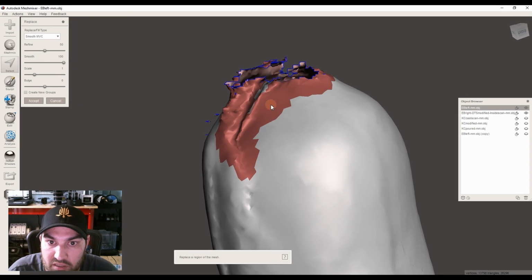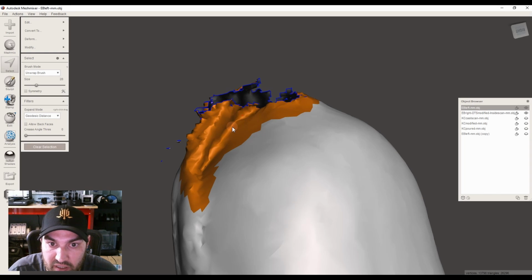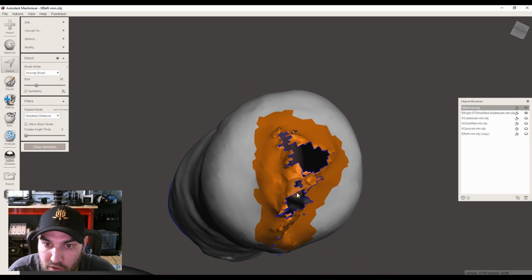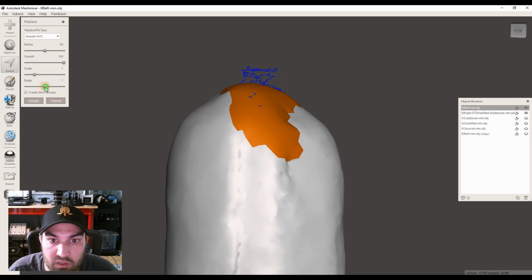So there's something missing. That's going to be why it's red. So cancel, find what's missing. And sometimes this is where I'll hold control and scroll up just to grab any little stuff, and then erase and fill and kind of get this using the bulge and the scale tools into a position where you like it.